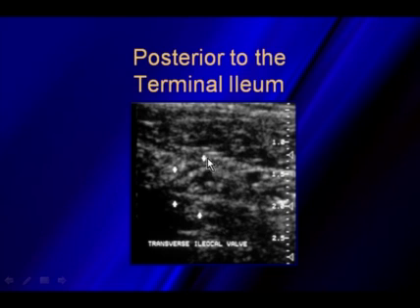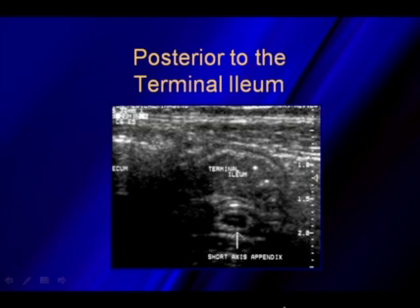So this is what the ileocecal valve will look like on sonography. It's not something that we look for all the time. I've got a picture of it here, but most of the time we really don't evaluate the ileocecal valve.